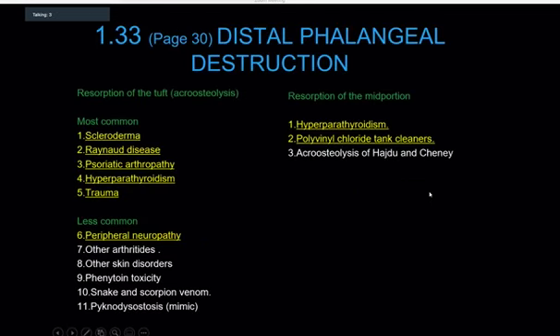Well done. Now, distal phalangeal destruction is a differential diagnosis, and in that, you can keep sarcoidosis also.